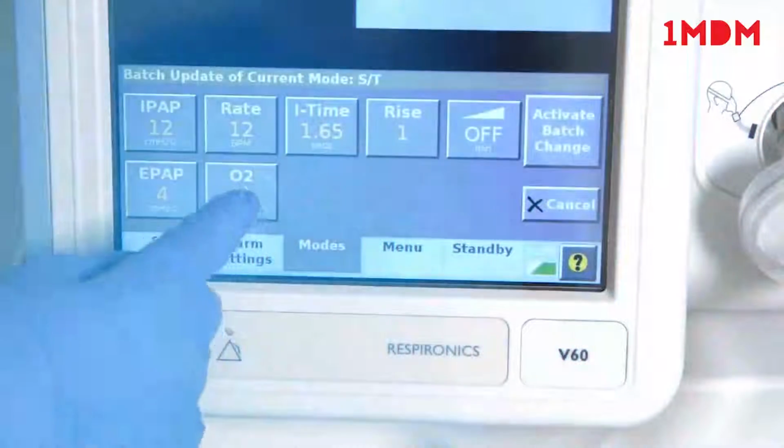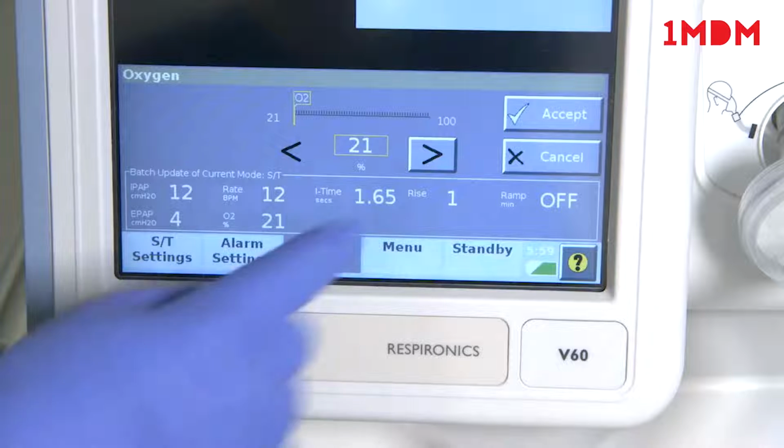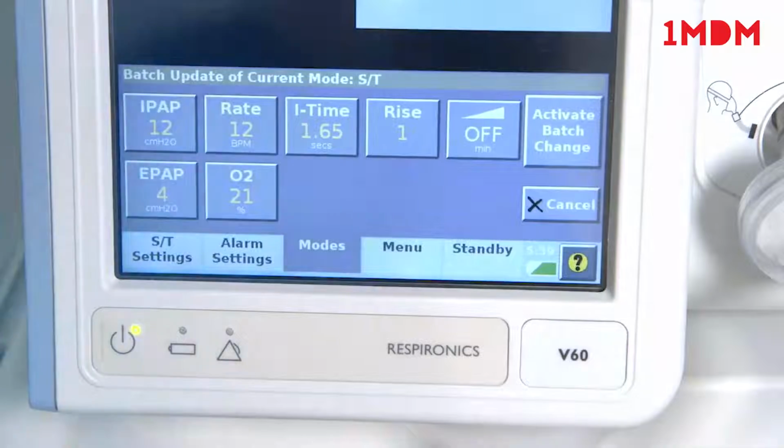The first thing to set is the initial inspired oxygen, or FiO2. This will depend on your patient's condition and the underlying medical problem. In most cases, especially those with type 2 respiratory failure in COPD, we would usually be aiming for saturations between 88 and 92%. It's important that the FiO2 is adjusted to achieve the appropriate saturation and oxygen levels.